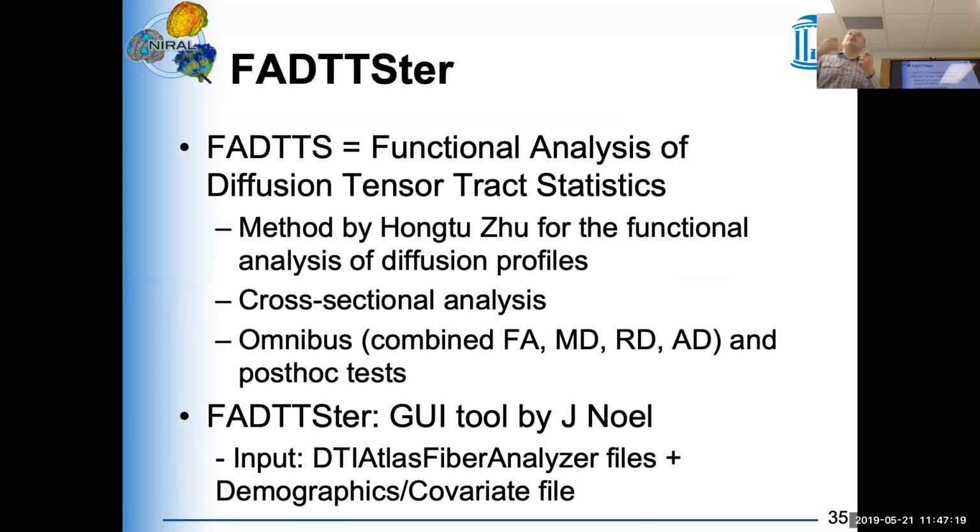And so it will give you basic information whether there's a difference using the profiles between group A or group B. This is a 2-group testing way. Or whether there's a significant association, let's say, with gender or age with your profile. And it does that on a global level without you needing to correct for multiple comparison or anything like that, even though we're looking at the whole profile. So that's the nice part of this functional analysis.